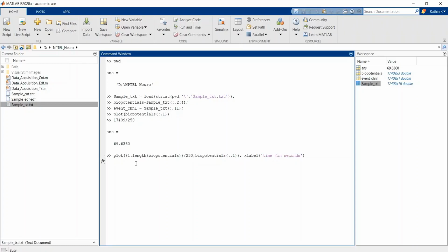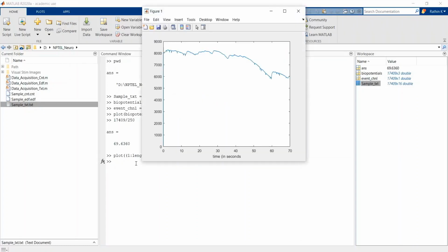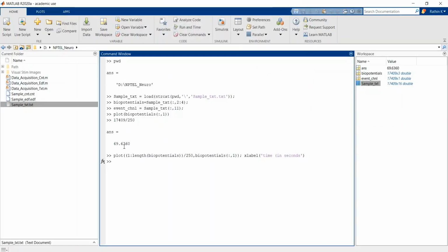Okay, so let's see. As I already mentioned, it's around a 69 second recording, so you can get it with respect to time. Now you can analyze that and check it further. Okay, let's see the triggers as well.